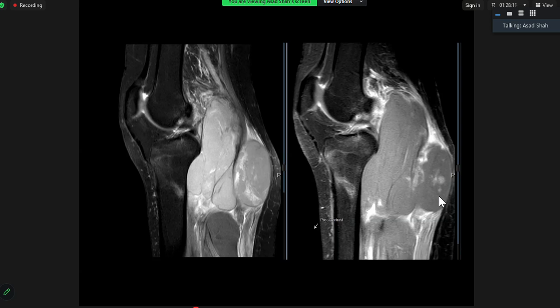The other one was periosteal osteosarcoma. The middle one, without any bony change, was a chondromyxoid sarcoma. I've just shown you a few things there. Depending on the age, the differential will change, and it can be a primary soft tissue tumor sitting next to the bone, or something arising from the surface of the bone, things like that.